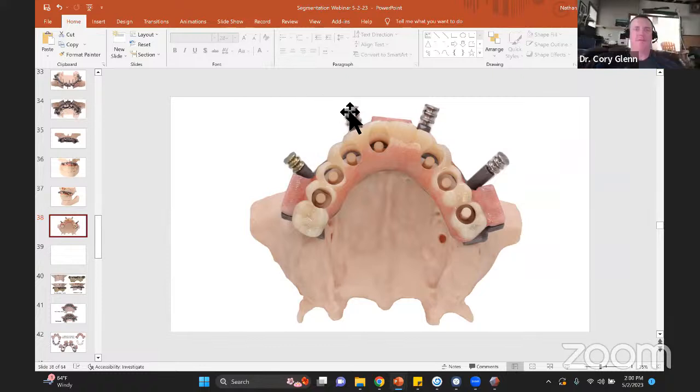So yeah. Let me throw one caveat in there though. I do find the facial scans to be extremely helpful, but I know you can buy these $300 scanners or some of the cell phone ones. Those are only going to be useful in as much as the accuracy is detailed enough that you can then stitch it back to your case in BlueSkyPlan.